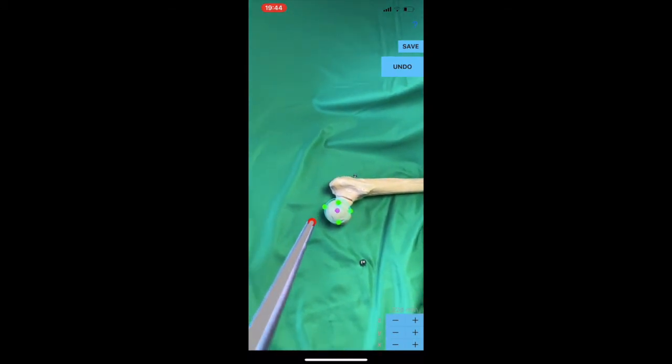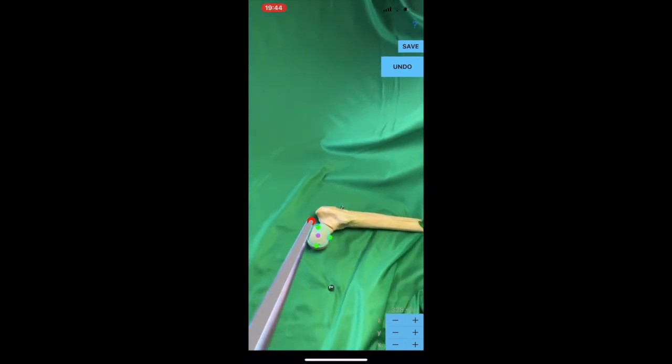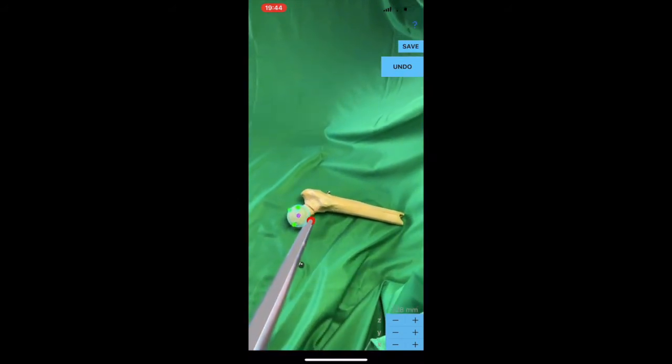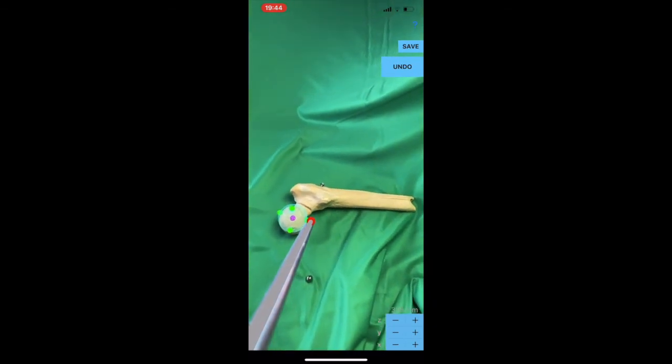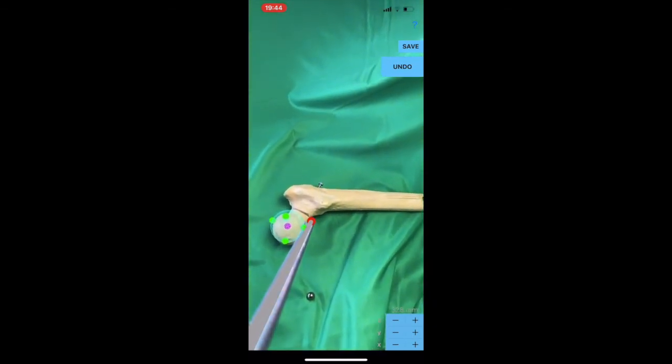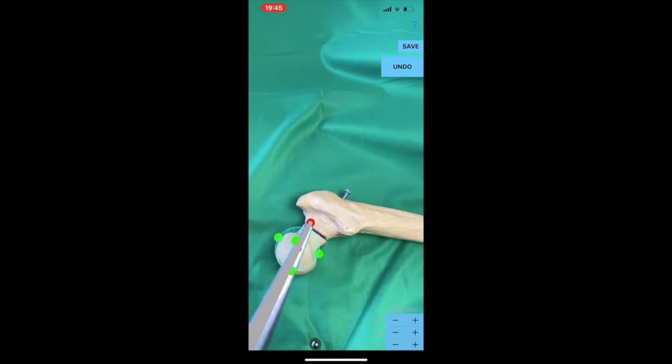By the registration of the last point, C4, a magenta sphere appears inside a blue sphere which overlays the circumference of the femur head, depicting the center of the femoral head, or the center of rotation of the femoral head, the C point.